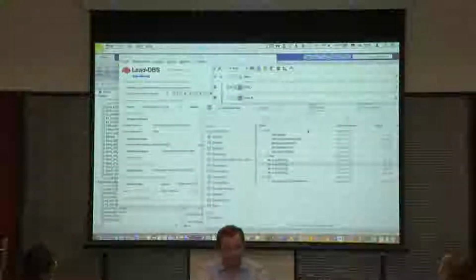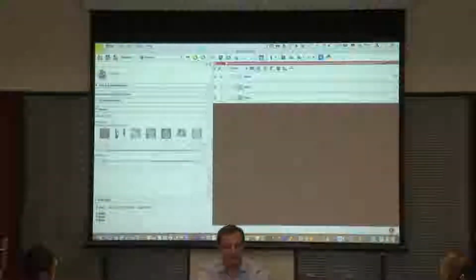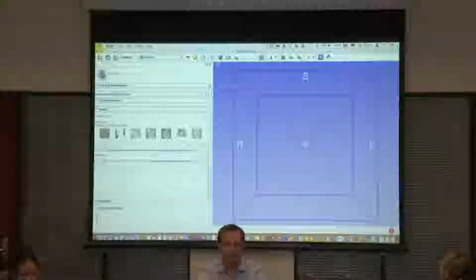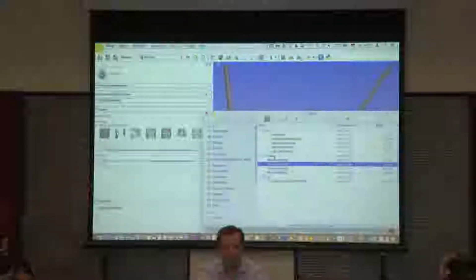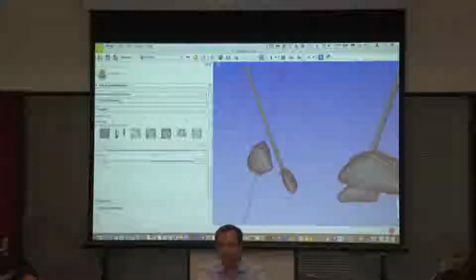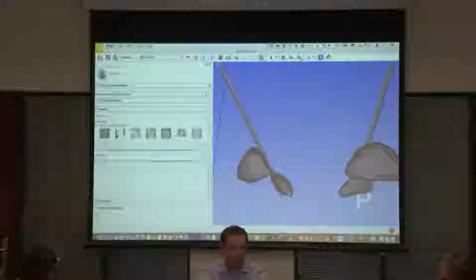If you like Slicer, just out of curiosity, Slicer will also work on these PLI files. We have to switch to the 3D view, but here we can see I just imported the electrodes, and if I do combine scene, I think it should show us all the scenes, and you could maybe even use tractography or similar things in Slicer.